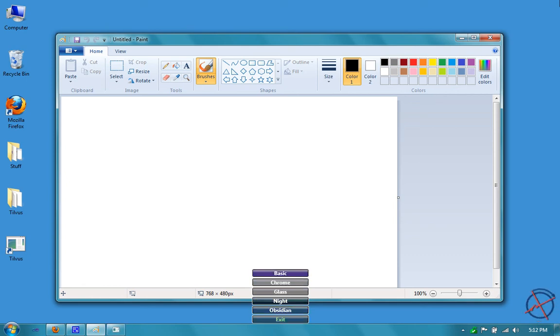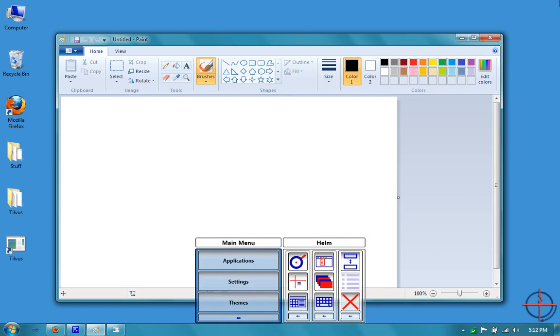Again, this is just more a personal preference. It doesn't really have an effect on how the program runs. It's just that the look and feel of it can be important to certain users, so I wanted to provide that option. So that's basically an overview of the different options that our software provides.